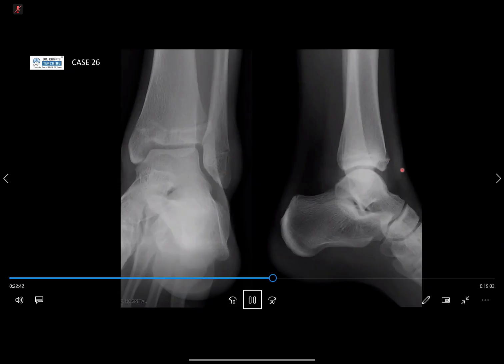Same goes for joint effusion. So you're seeing bulging of the anterior capsule and bulging of the posterior capsule. So there's a large joint effusion. And then when you're looking at that, you're thinking of any intra-articular processes going on. It's trauma, so I won't be thinking of JIA. But if you look again closely, you're drawing contours. If you come down the metaphyses and suddenly you've got a little step here, okay? And then you wonder, yes, I know physis can be irregular in the distal tibia, but I just wondered if there was something a little bit odd in the front bit here.